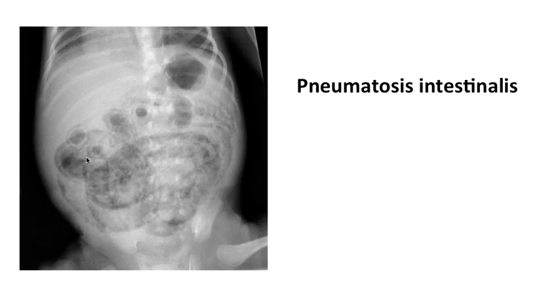So there is this black outline of the bowel wall, which is even better seen in the transverse cuts. For example, seeing this target sign kind of appearance is very classical of pneumatosis intestinalis, and this is typically seen in necrotizing enterocolitis in premature babies.